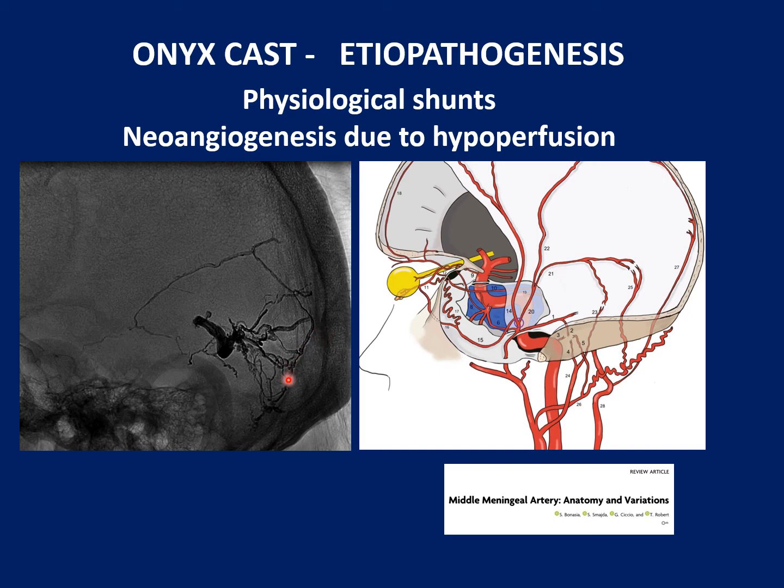That is this particular structure, this black line, you can see it. It has the same morphology like this, close to the skull base, a line which is running here. These two branches are basically the mastoid branches which arise from the occipital artery. That is also seen here. This is the occipital artery mastoid branches. This is a jugular branch which is coming from the ascending pharyngeal, whose proximal part is seen.